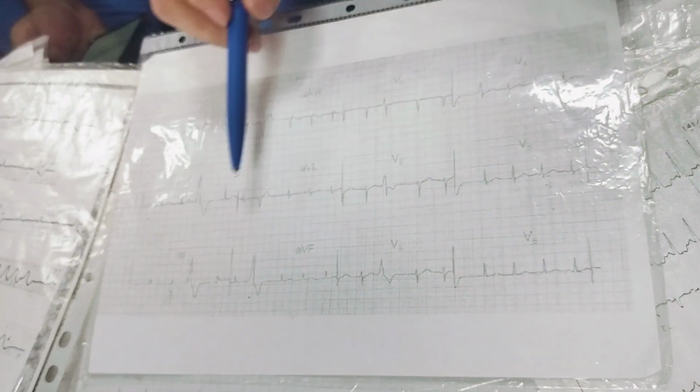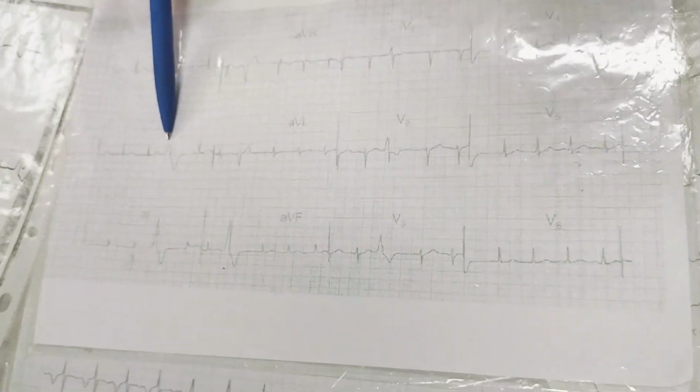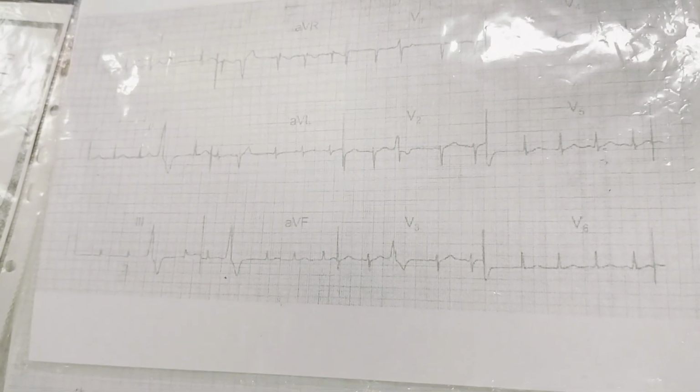Extrasystole, ventricular one. These rounded places are visible from a distance. Short interval, long interval after, the complex is deformed. That's why it is ventricular extrasystole.